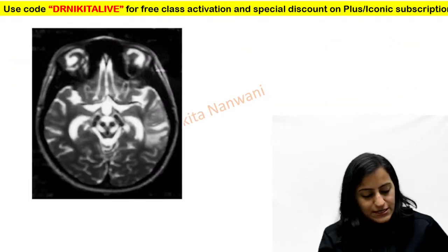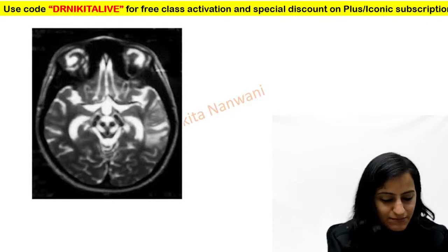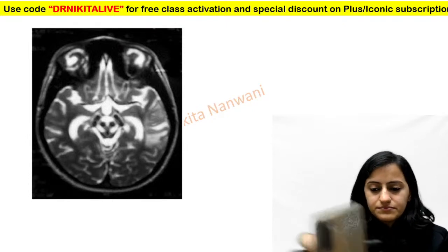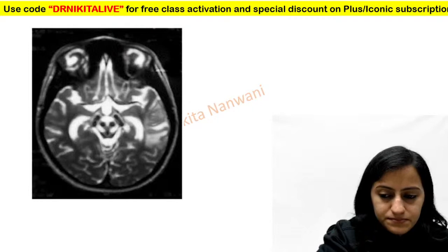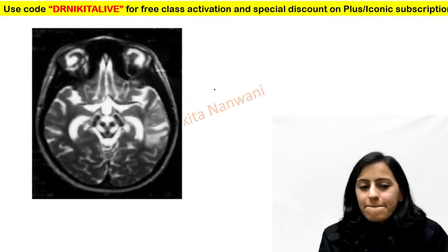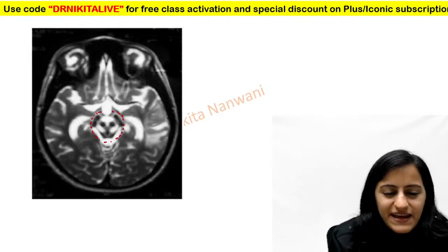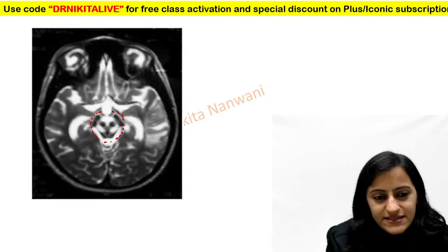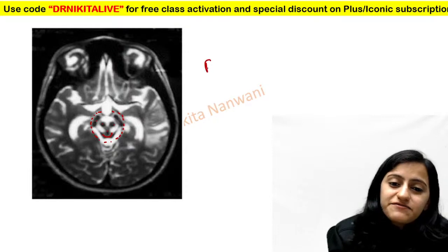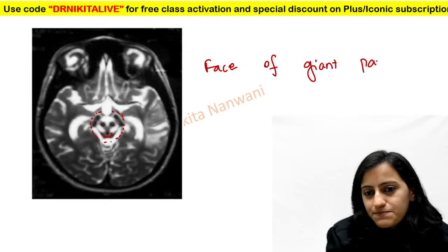Next one, what sign do you see in this image? So staring at you, there is something which you can see. What sign is that? Absolutely right. So in this midbrain area, you can see some face here. These are the ears, these are the eyes, you have the nose and you have the mouth, right? So that is the face of giant panda. Okay, that is the face of giant panda sign.